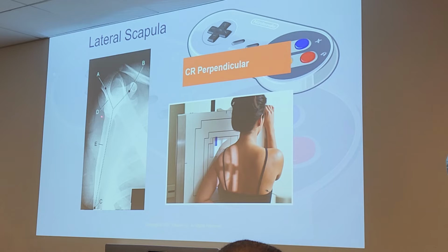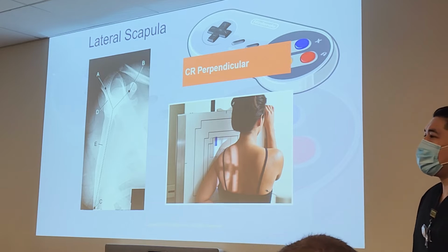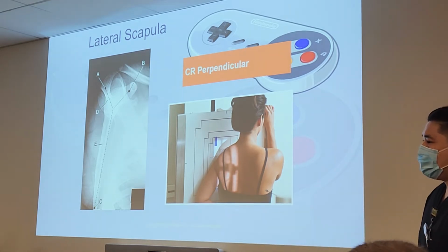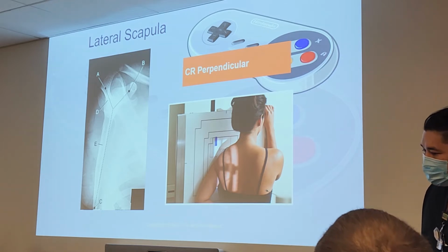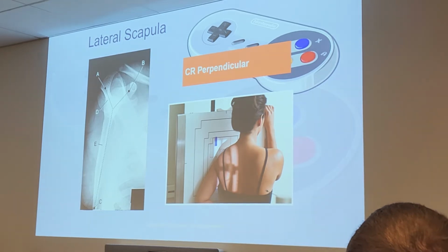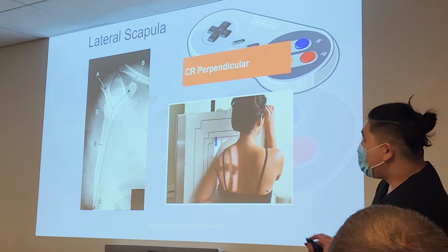So we see that nice Y. Those are so hard to perfect in clinic when you get there. Kind of shooting blind on those. You'll hear every tech under the universe say, "My way always gets it every time. This is the best way to get this X-ray." So everyone's got their own version of doing this exam. Ideally, you'll find it, but once you get one and you see that nice Y, you're gonna feel so proud of yourself. Let's go over some more anatomy on here.